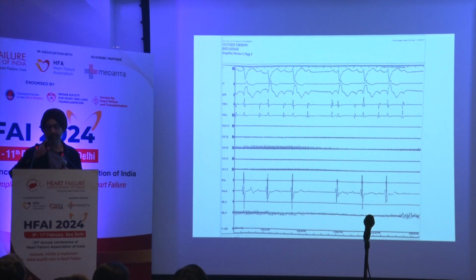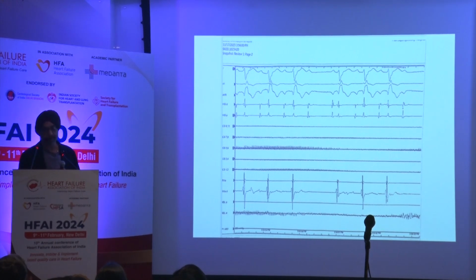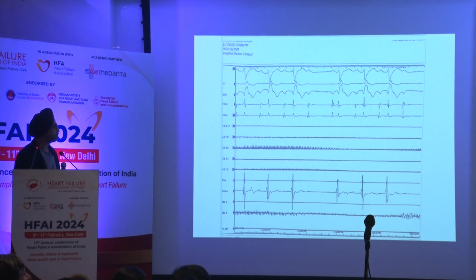This patient cannot do without pacing. You cannot leave this patient without pacing. If you had given this patient a Holter, next morning probably he would have come with pauses on the Holter. What's abnormal in this? Physiologically, what is abnormal? Wenckebach is generally a feature of the AV node. It's a calcium conducting structure.